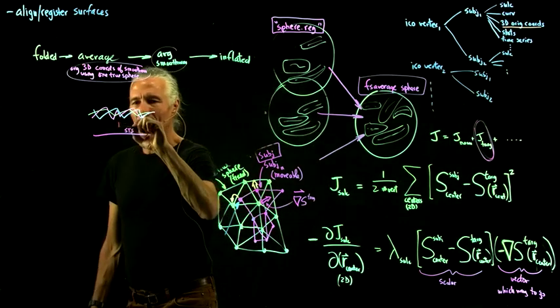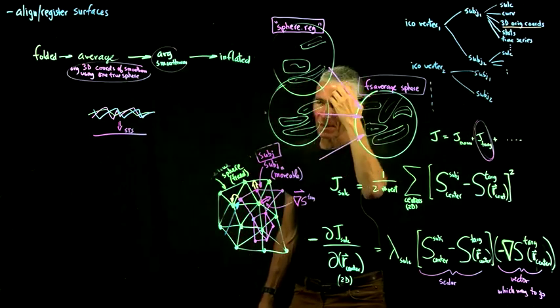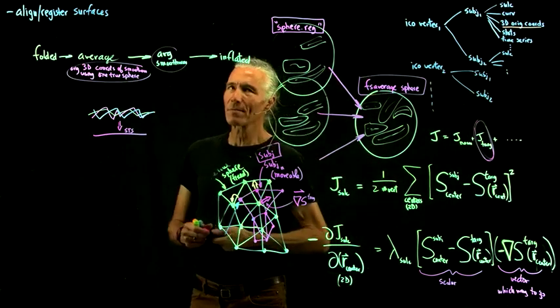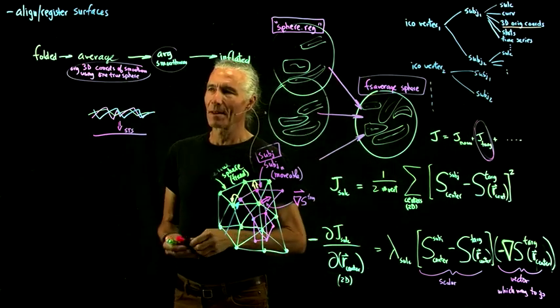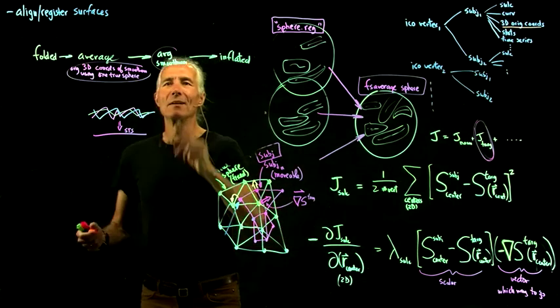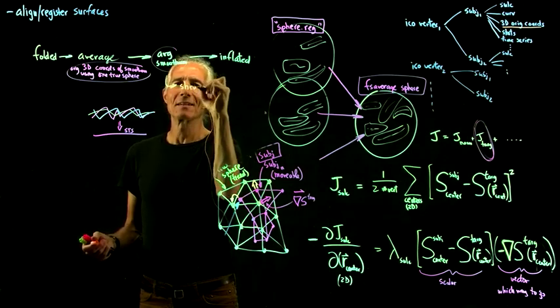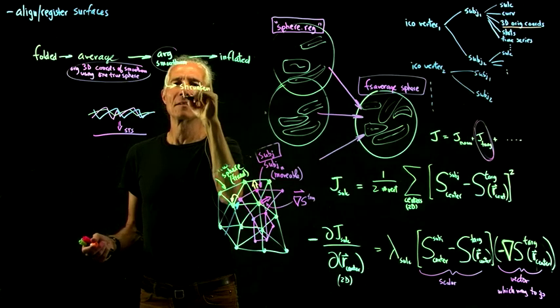That's unfortunately going to lose some surface area, about a third of it. So what's the problem? This is a shrunken brain.